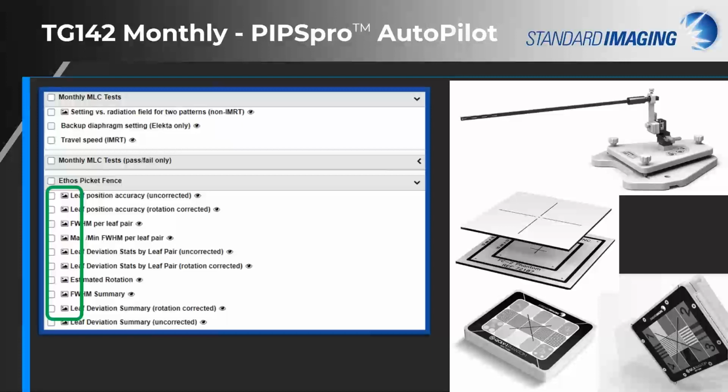Image-based tests are easily denoted with our little image icon here. PIPS Pro Autopilot includes image tests acquired using the PIPS Pro set of phantoms, but again, we are vendor neutral and do analyze, trend, and report on test images acquired with other commonly used phantoms as well.